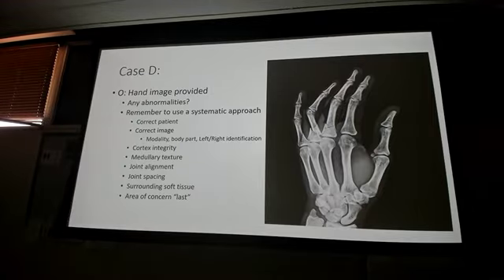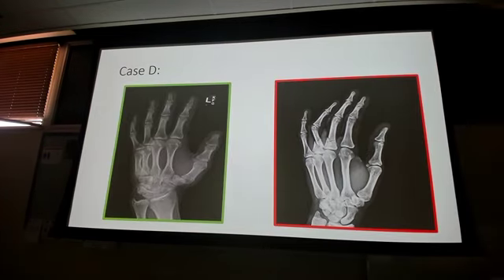All right. Here's what we got. You notice how on every X-ray I have the systematic process? I have a systematic process. Let's go to the normal versus the abnormal, just so that way you can see it better for those that are using the screens up front.